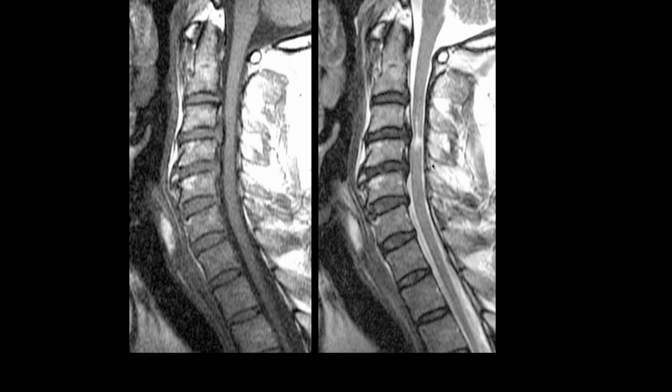Okay, so we have two sagittal views of the cervical spine. There is abnormal signal at the level of C3, C4 in the cord, and we have all these disc protrusions. So this is something that people have feared for a long time, and it caused a lot of people to have surgery. There was a concern that disc herniations in the cervical area could press upon the cord and produce ischemic changes of the cord, and then basically dysfunction at that point. So this drove a lot of surgeries.